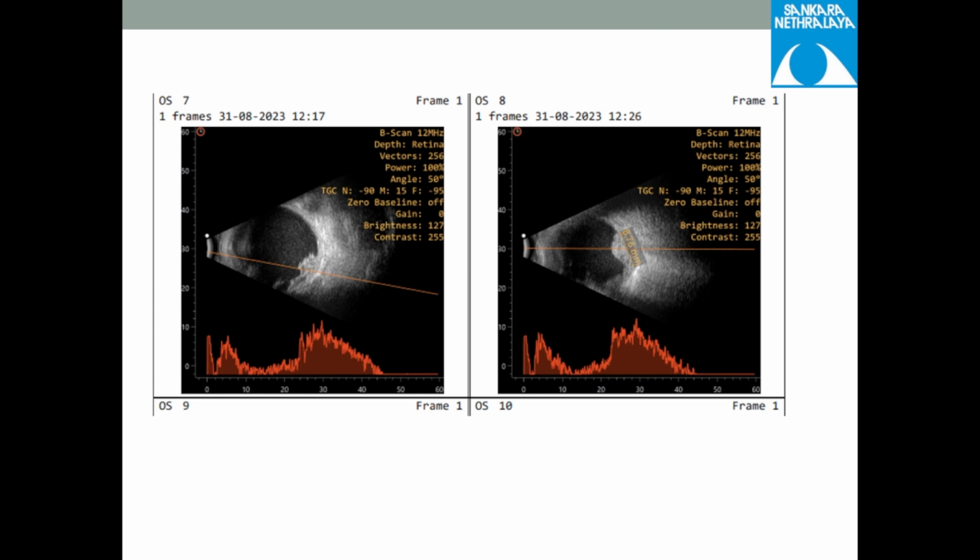No, it's not called acoustic. What do you call that? Angle kappa. So what is angle kappa due to? The ends are highly reflective, and the sound is attenuated. Yes, severely attenuated when it passes through the tumor. So by the time it reaches the base, the energy is lost. So you get a gradual decline in the reflectivity. That is why you get the angle kappa, whatever you call it. It's a line from the highest point to the base of the tumor.